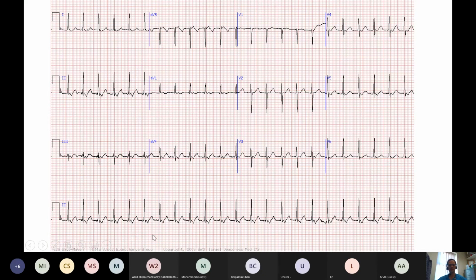Can you see anything about this that doesn't look like a normal part of the ECG? Delta wave, yeah, I can see what you're trying to tell me, but if you look, it's pretty abrupt. Yes, very good, Malvika. So can you see here?